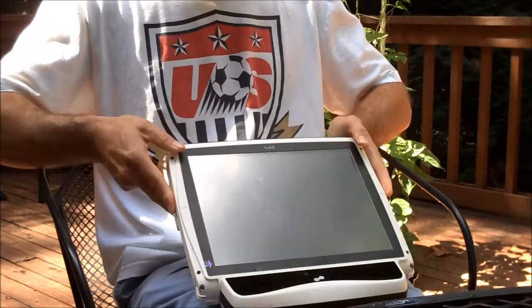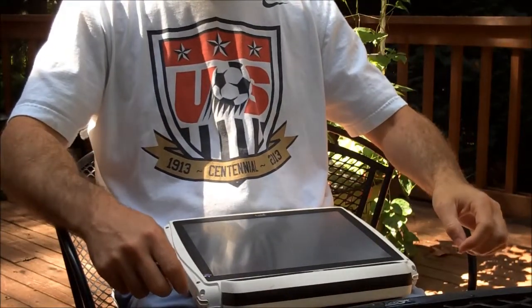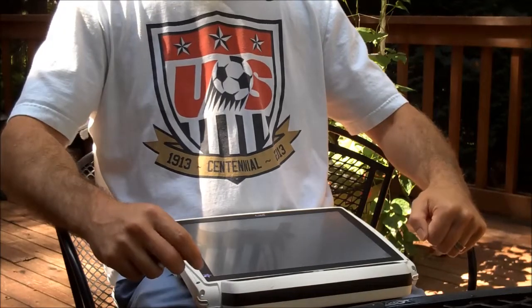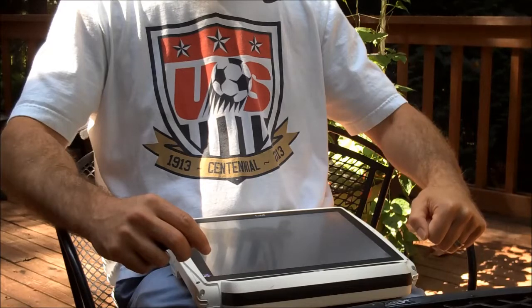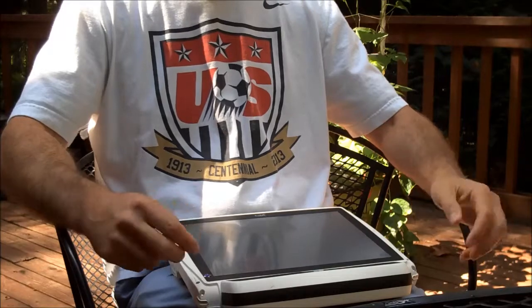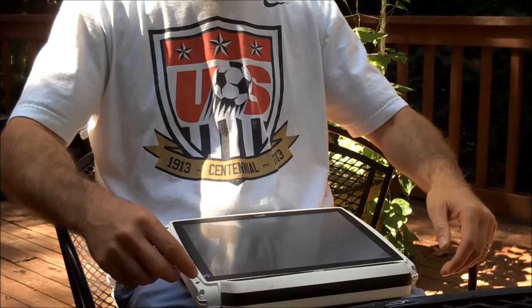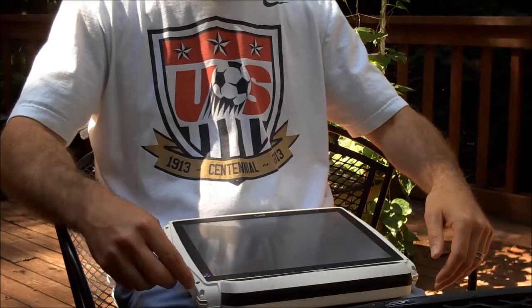That leads me to one of the headaches that I have with the AAC devices on the market today: how to manage and maintain page sets. Jay's at an age and at a communication level where I am constantly tweaking and making additions to Jay's page sets and vocabulary, reacting to the fact that Jay wants to talk about various different things. So maintaining the page set is something that happens quite often.